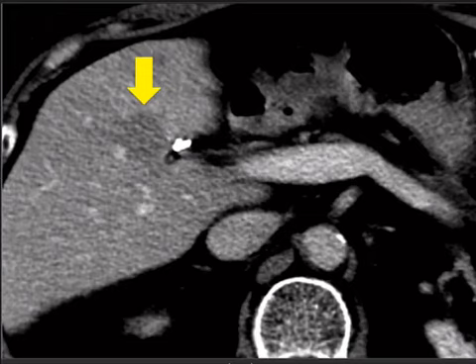But I want to point out something else also, because as a modern radiologist, you look at things in 3 planes, and you scroll up and down to orient yourself, but you don't have that luxury here. Right there, notice those clips, okay? When you see those clips, you're right at the gallbladder fossa. So immediately you should be thinking to yourself, what happens right near the gallbladder fossa?